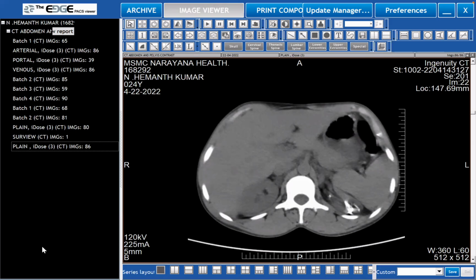Sir, the left kidney is smaller in size. Reniform shape is maintained, sir, but it looks contracted. And sir, there are multiple radio-dense opacities seen in the pelvis, and also in the interpolar region of the left kidney. And sir, in the left kidney, also some calyceal, no sir, parenchymal thickness also appears to be a little less in the left kidney, sir.